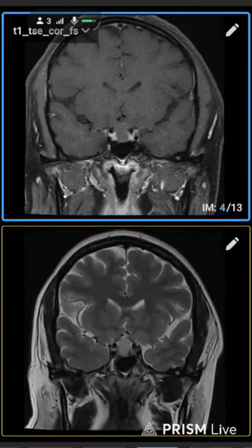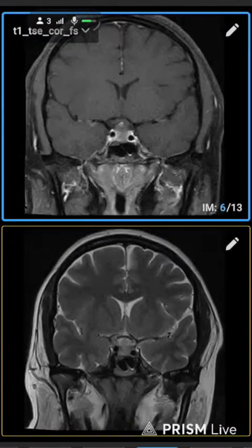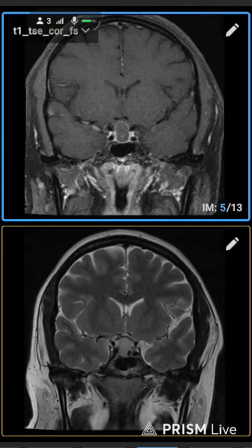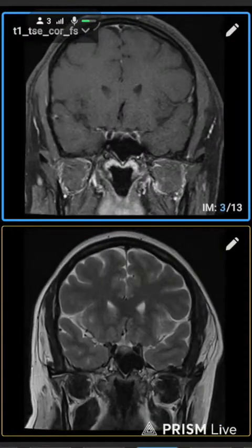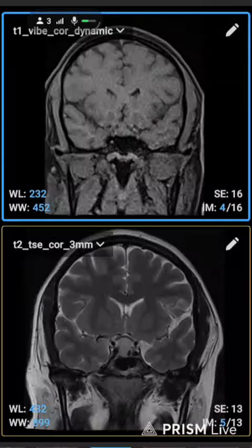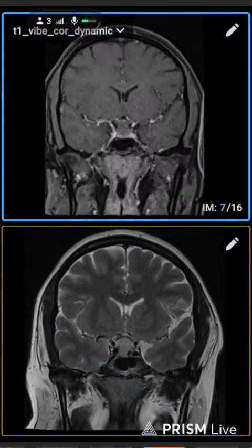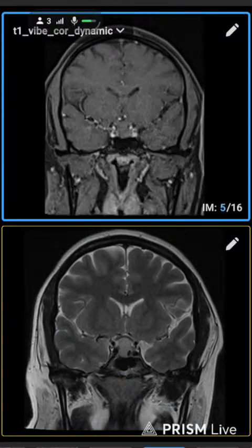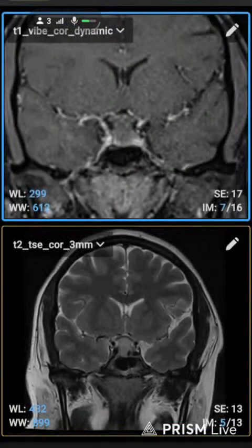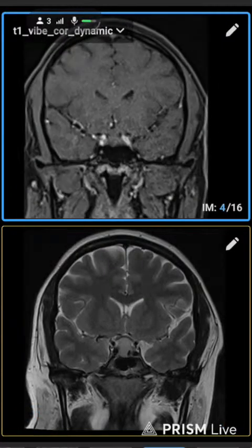So we will see if there was a washout or if there was an enhancement after the scan. So it will identify if there is a lesion. Some lesions enhance in arterial phases, so dynamic is needed in pituitary, and in liver and prostate also.